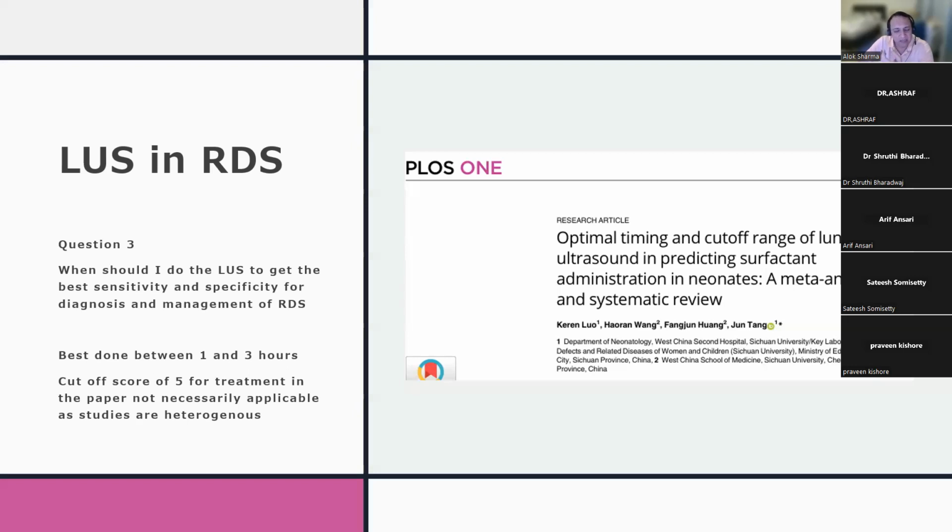That's so beautiful. Can I just say that if you have fluid in the first half an hour and it gives you an AIS pattern and that gives you a B profile, and you end up treating that baby with surfactant, you will be treating a proportion of babies, especially between 28 and 32 weeks of gestation, steroided girls, good sized, lung spared regions. You might end up treating them unnecessarily if you do your scan too early, because you'll get a high lung ultrasound score because of the presence of interstitial edema.